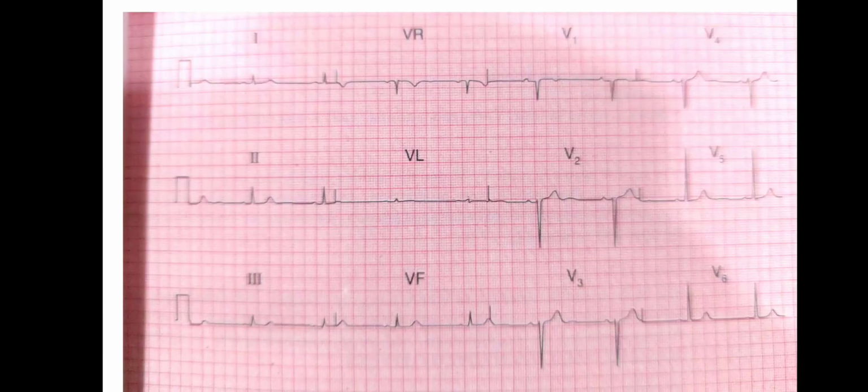In this last ECG, commenting on the rhythm, you are able to find the P wave, so this is a sinus rhythm. After counting the number of boxes between the two R waves, you can get to know that the rate is between 40 to 50 beats per minute. Both lead 1 and AVF are upward, so the axis is normal.